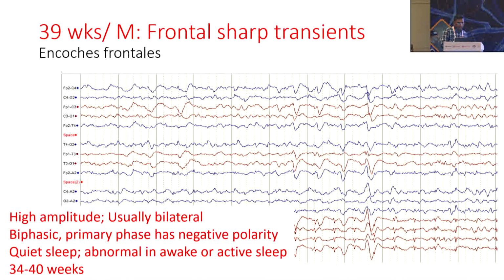So only the last slide. Sometimes frontal sharp waves can be physiological, right? In newborns, we don't really search for spikes. So spikes are the least of our concern in neonatal EEGs. More importance is given to background description, whether the background is appropriate for that gestation or is excessively discontinuous or low amplitude. That is a major concern. Second is to identify any electrographic seizures. So these are the two main indications for which we do neonatal EEGs.